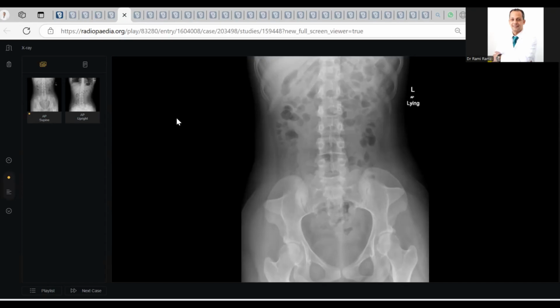What's your diagnosis? My differential is nail patella syndrome. I would also ask the patient whether there is any lack of patella in the knee on clinical examination. Which part of the body do you want to take another X-ray for this patient? If there is no previous radiograph, I would ask for a radiograph of the knee, AP and lateral, to confirm the absent patella.